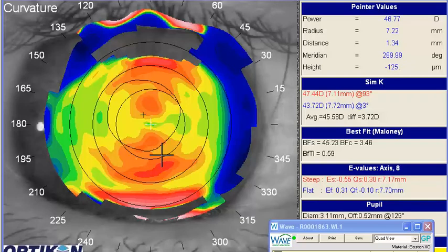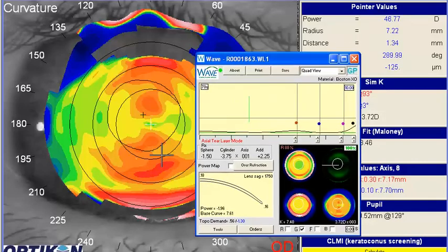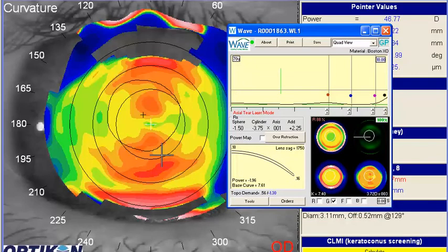If we look at your lens design itself, this is the most recent design, I believe. One of the things I noticed is that when you pulled your data into Wave, you end up with a rather spherical representation of the cornea. If you remember, this bottom view is the Wave simulated topography. This, of course, is the back surface of the lens. And if we look right here, this is a rather spherical looking cornea. So I suspect that, once again, Wave averaged the astigmatism in.